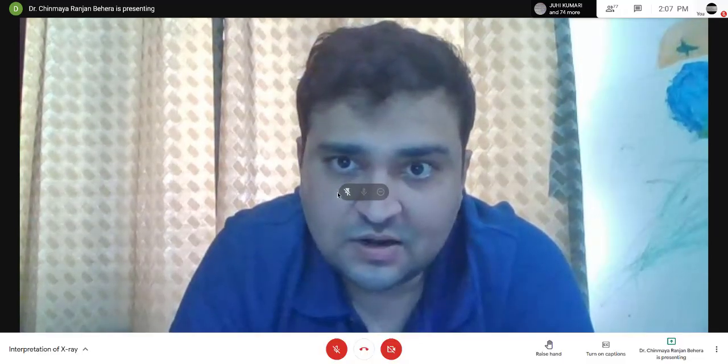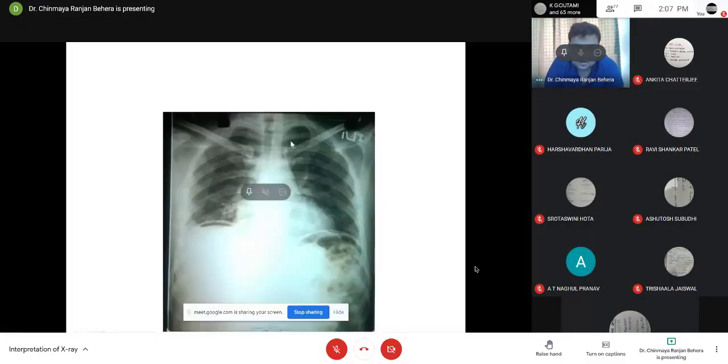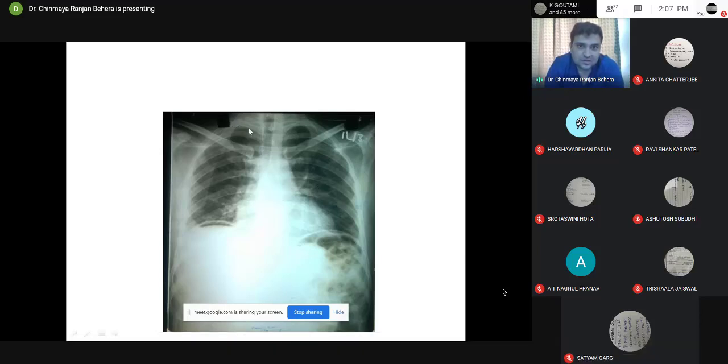You will see, is there anything? This is the first rib, this is the second rib, this is the third rib, this is the fourth, the fifth, sixth, seventh. So the ribs are okay, fine. On this side also, the ribs are okay, fine.